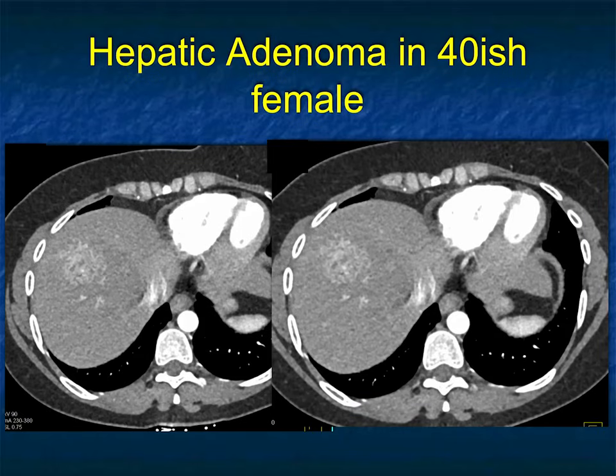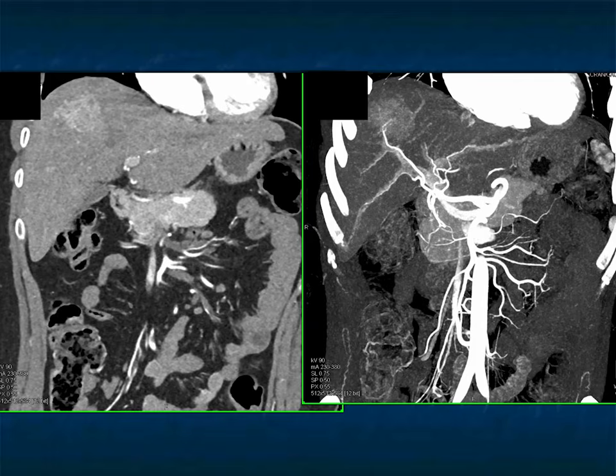Now, other vascular lesions. Here's a vascular lesion in a non-cirrhotic liver. Now, again, you can have a hepatoma in a non-cirrhotic liver, but vascular lesions, particularly like this that are irregular, I've got to think about hepatic adenoma. I've got to think about metastasis from a neuroendocrine tumor or renal cell carcinoma. I have to think perhaps about an atypical hemangioma.